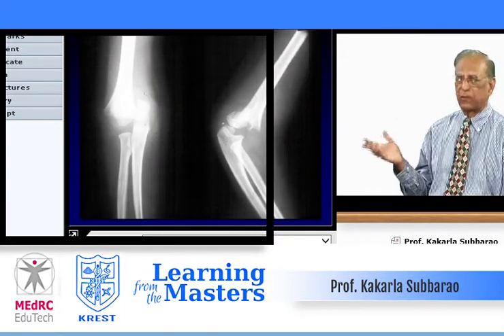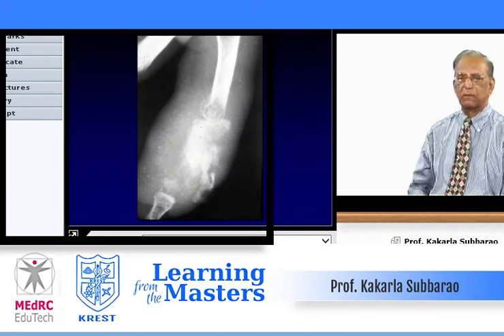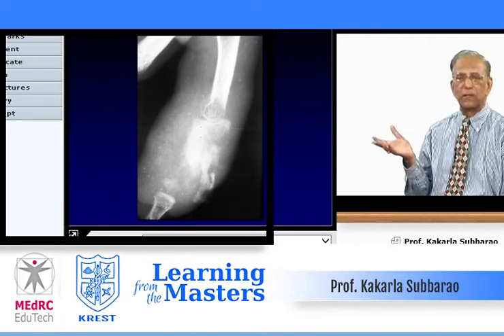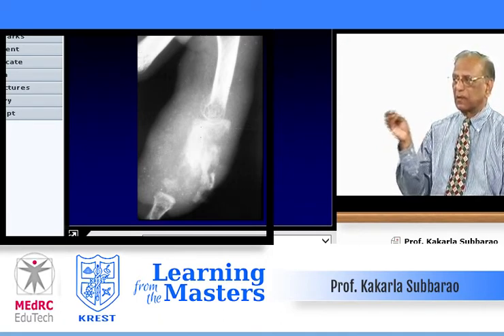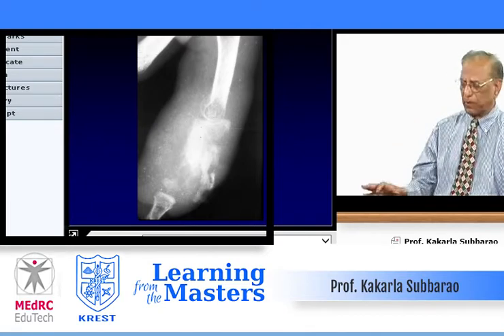Supracondylar fracture, not so uncommon. And then acute fever, high temperature, swollen thumb, pain. This is not injury, but it is osteomyelitis. Look at the edema, look at the destruction of the proximal phalanx, and already some sequestration is formed. But still they may come as acute pain.